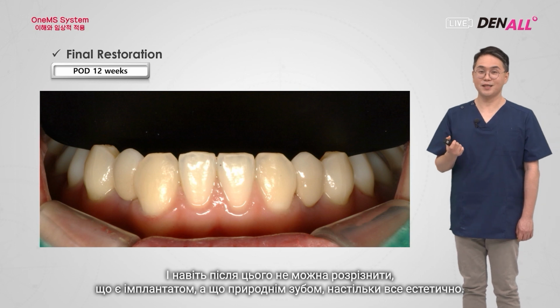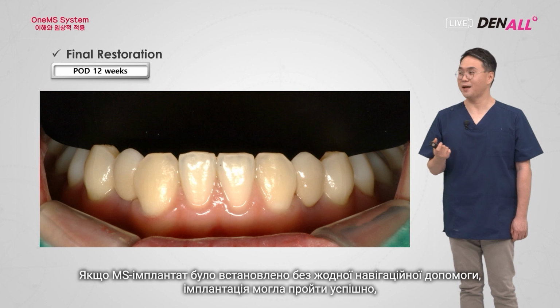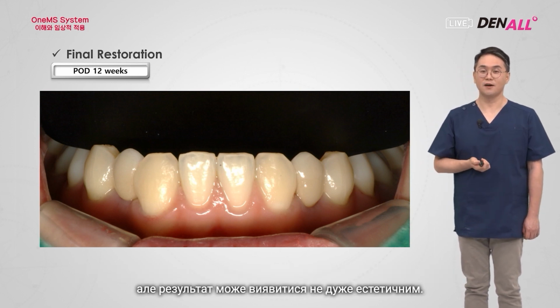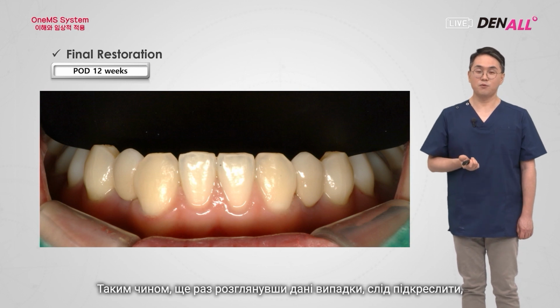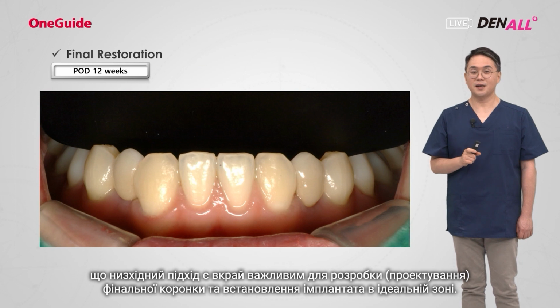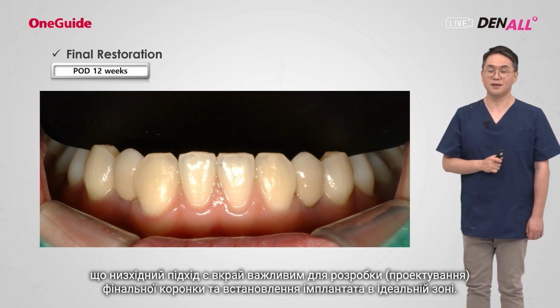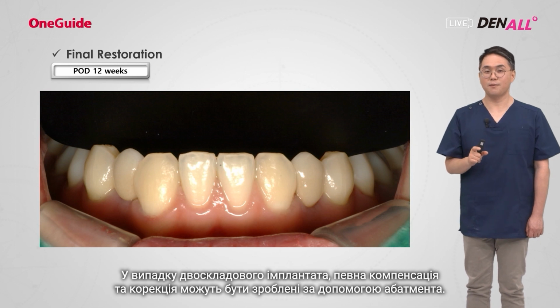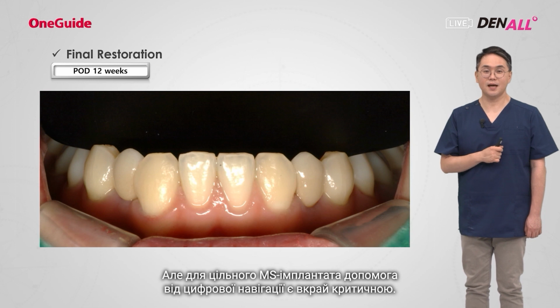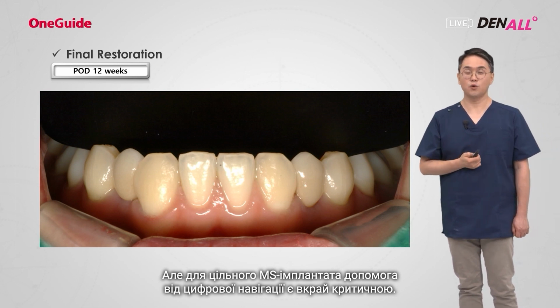So it's very aesthetic. If the MS implant was placed without any support, it could have gone okay, but it might also not have been very aesthetic. Looking at these cases, again, the top-down approach is very important. Design the final crown and place the implant in the ideal area. If it's a 2-piece type, using an abutment, some compensation can be made. But for a one-body MS implant, the help from the guide is very crucial.